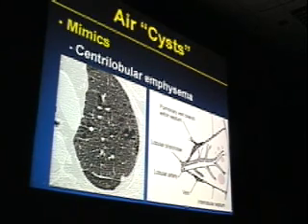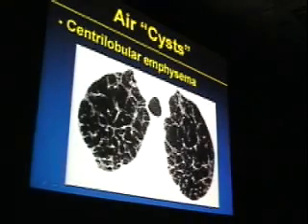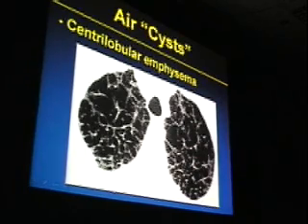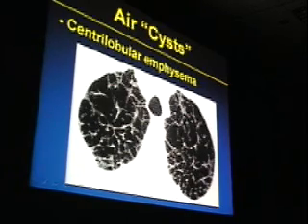It's pretty clear-cut emphysema. The problem is you'll occasionally see cases of very advanced disease, as you see in this particular example. And with very advanced disease, you can also get a fair amount of fibrosis in the interlobular septa. So you get thickened septal walls, diffuse emphysema within the secondary lobule there, and it looks very much like a cystic lung disease. This looks like maybe end-stage EG or something like that until you look at it very carefully.